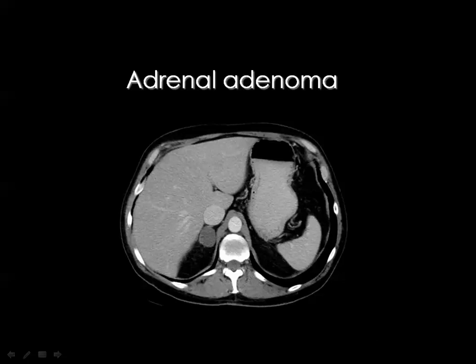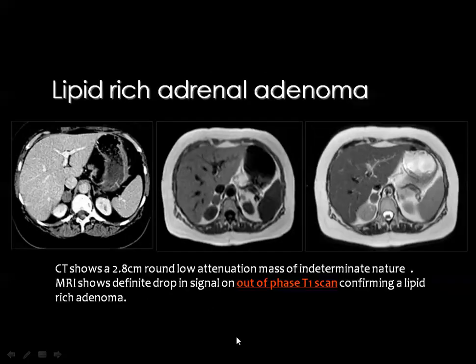But what is very important is the washout of the contrast seen in the delayed scans taken 10 minutes after contrast injection. And you see here the CT scan of a suprarenal adenoma on the right side showing a relative hypodensity. Then in order to be sure that this is a lipid-rich adenoma, there are some ways.